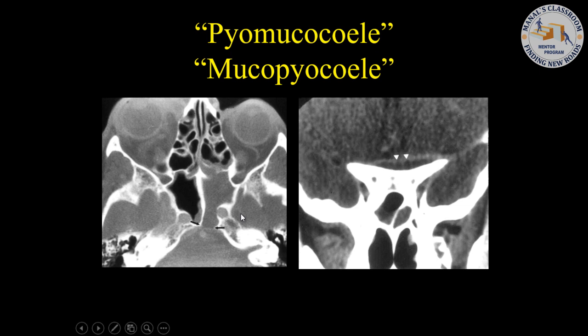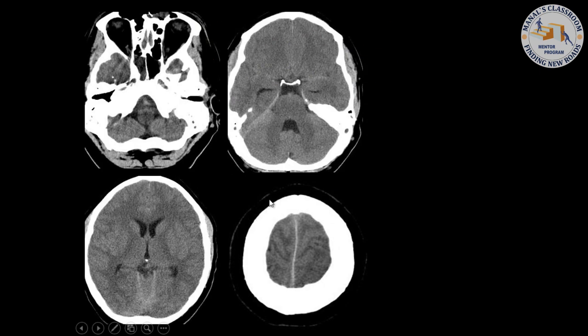The other thing that we have to remember is that when you have mucoceles and they occur in the sphenoid sinus, it's a very, very sensitive area, because when we look at the sphenoid sinus, realize all the sensitive structures around it. So in this case, this was an old case that demonstrates a mucocele involving the sphenoid sinus. There's erosion of the posterior wall. And on the coronal images, this just demonstrated a very nice but a very subtle case of an empyema involving the planum sphenoidale.